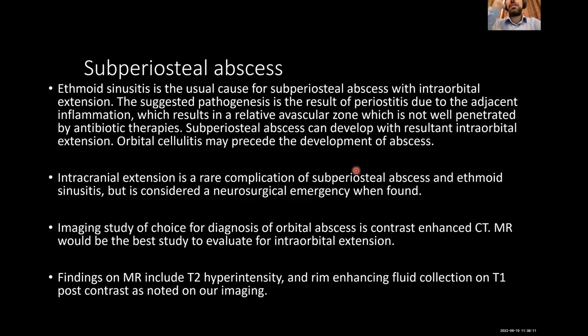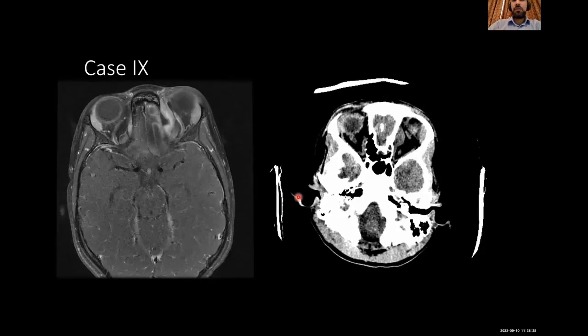This can be easily managed when you diagnose it, when you see it and interpret it correctly. This is very helpful. Yeah, here it is. You will find this. Compare between both sides, these lacrimal glands, and here it is. This is a subperiosteal abscess.